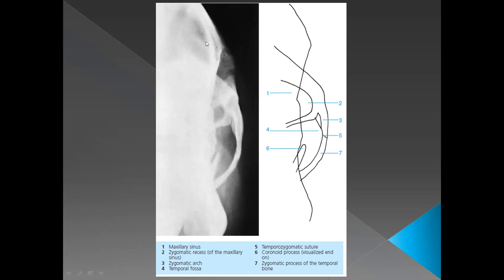If we underexpose it, it will become darker, and if it is overexposed, it will result in a brighter image. No, actually, you've gotten it the wrong way around, Dr. Sagba. If you underexpose it, then you will see the image as more bright, okay? And if you overexpose it, then it will look blackish to you. Like, look at this X-ray, this is basically an underexposed X-ray. So it is overall looking quite whitish to you.